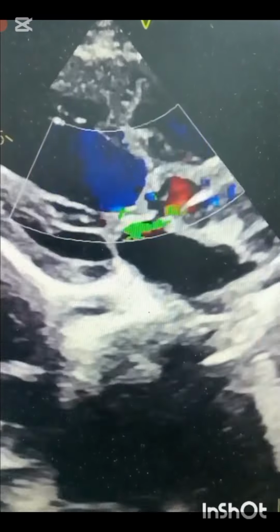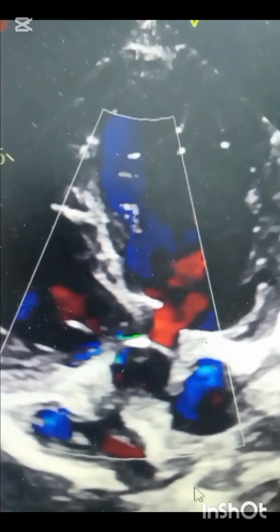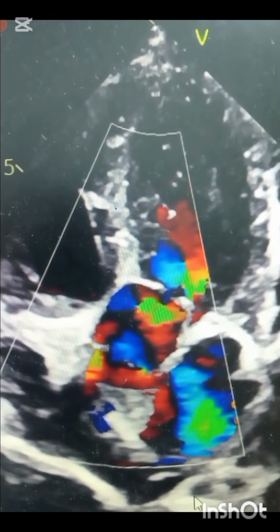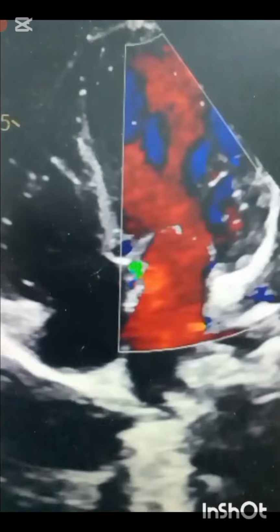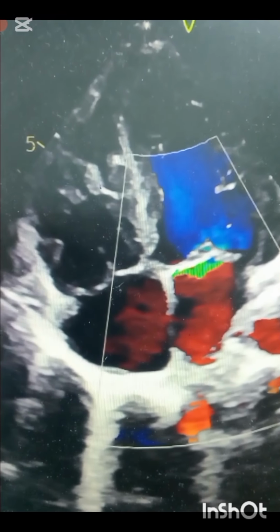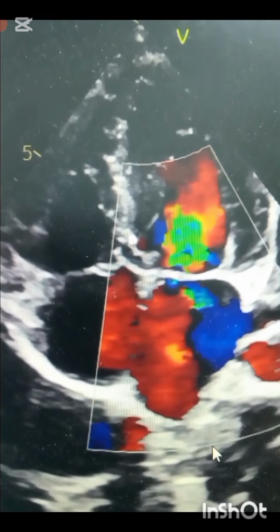What is the complication of the two lesions combined? The danger of the double load: when subaortic stenosis and cleft mitral valve exist together, the left ventricle faces a double burden, pressure overload from the subaortic obstruction and volume overload from the regurgitation of the cleft mitral valve. The combination rapidly worsens LV remodeling, reduces cardiac output, and increases the need for timely surgical intervention.